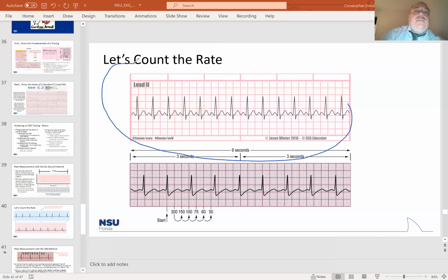We're looking at this guy up here. Okay. So let's look at our R's. So R, so on and so forth. Boom. Okay, cool. What you can do, it's really hard to see on that particular paper, but what you can do, especially if things get very fast, the R to R's get really close together. So then it gets kind of hard to calculate the rate sometimes.